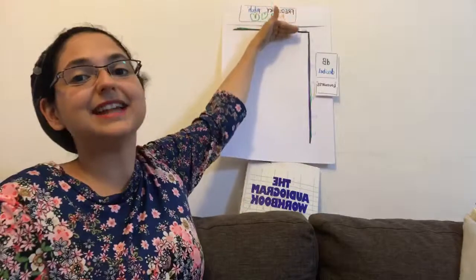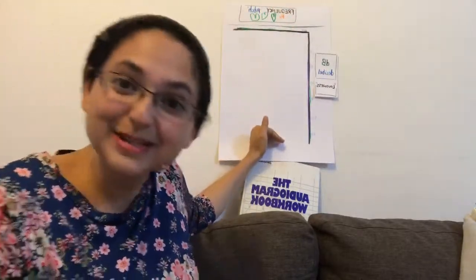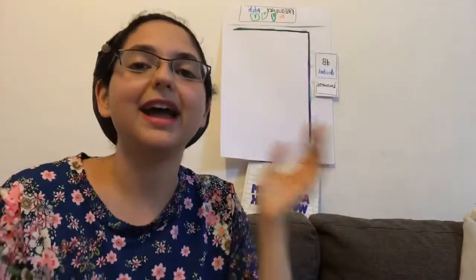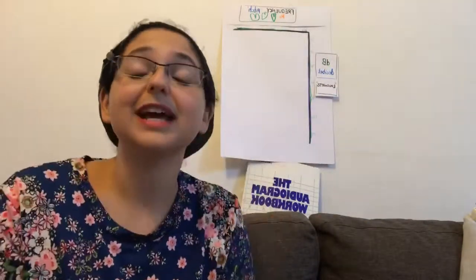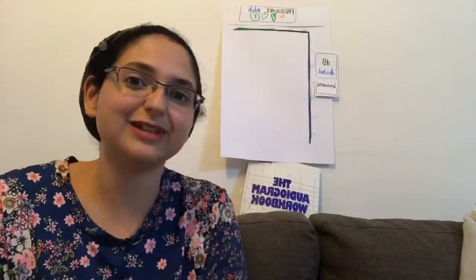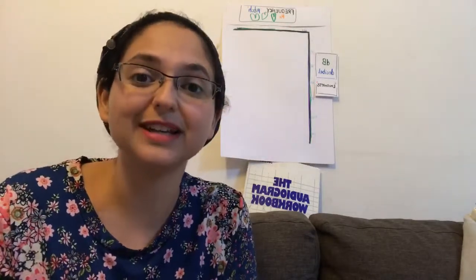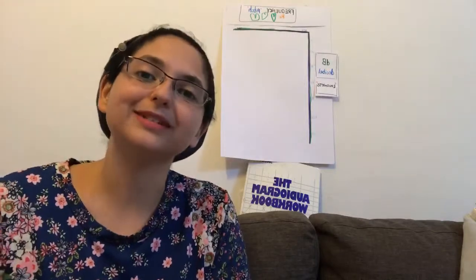And then going down the chart, we have the decibel scale, or how loud were the sounds that we made for you to hear them, right? You're in the booth and you're wearing headphones or earphones and the audiologist is playing sounds for you to hear. You have to raise your hand every time you hear the beep. So what the audiologist is trying to do is find out how loud do the beeps have to be before you're able to hear them.